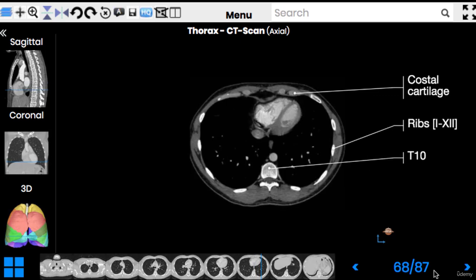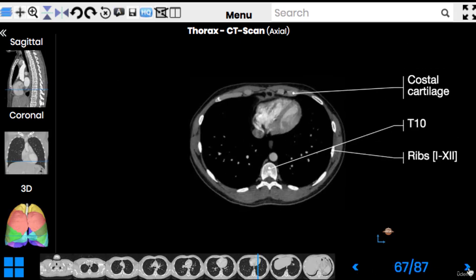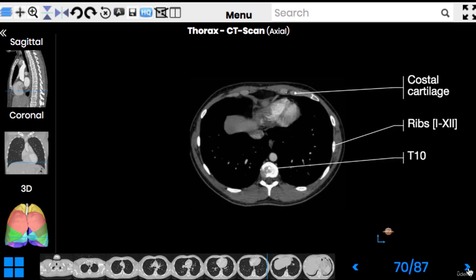As I scroll down and as I leave the right atrium, two vessels appear. The round-shaped one is the inferior vena cava. We don't have the superior vena cava any longer, but we have the inferior one. Here it is. And the other vessel, which is just in front here, this is our coronary sinus. They both come here to enter the right atrium, and we can look at them here.